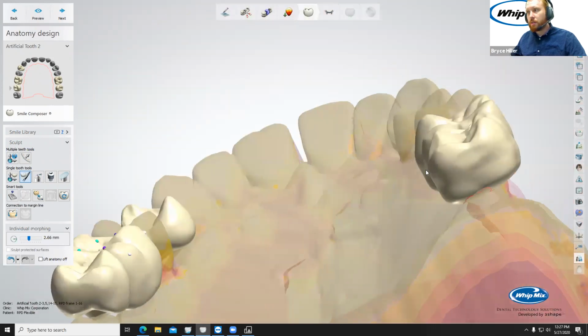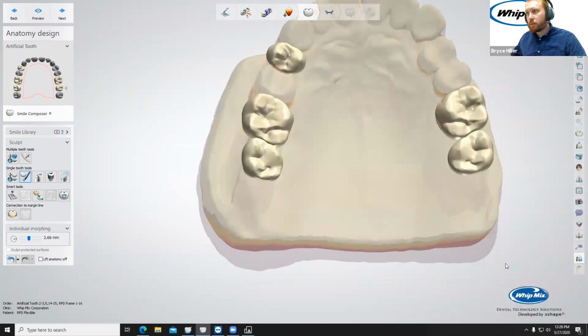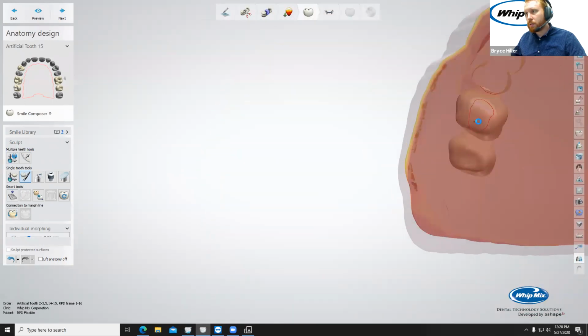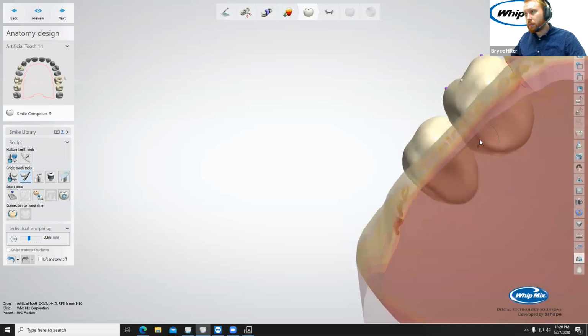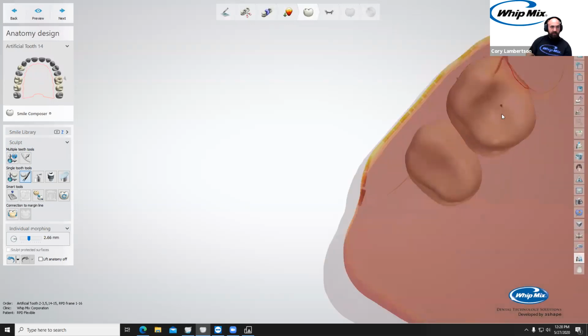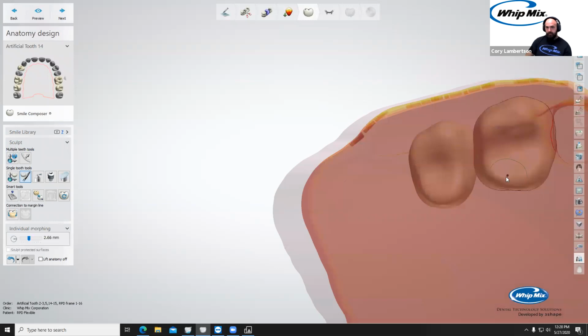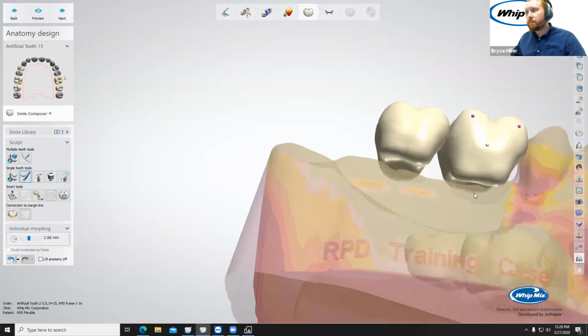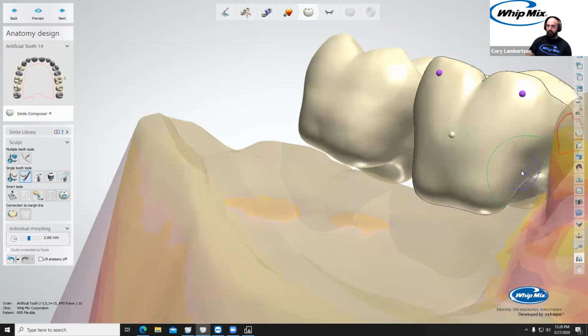All right, let's go over here. Now people are probably watching and seeing you whip through this like it's no big deal. How many years of experience do you have designing in 3Shape, Bryce? What year is it? This is 2020, the year I think everybody wants to forget.